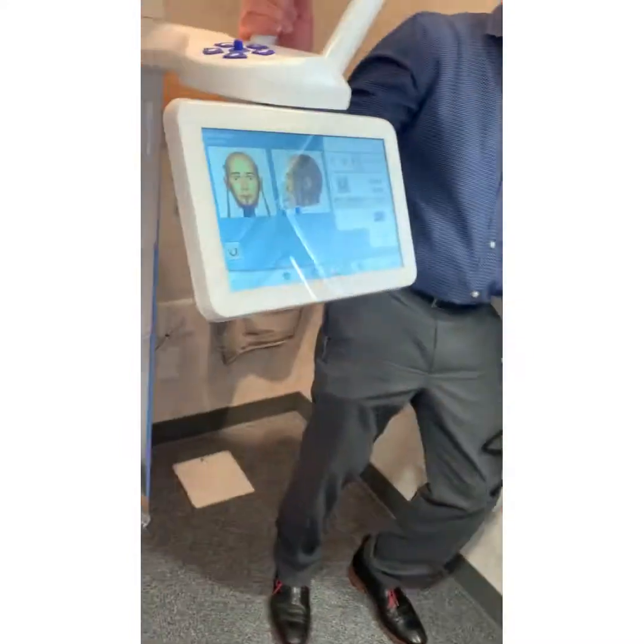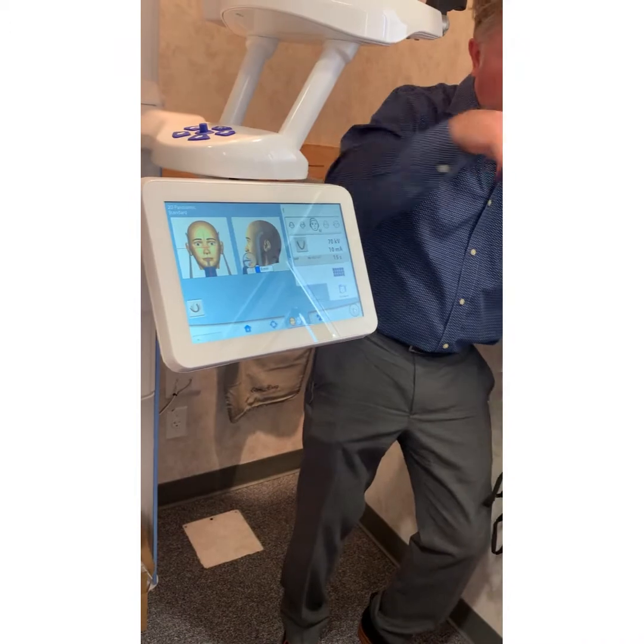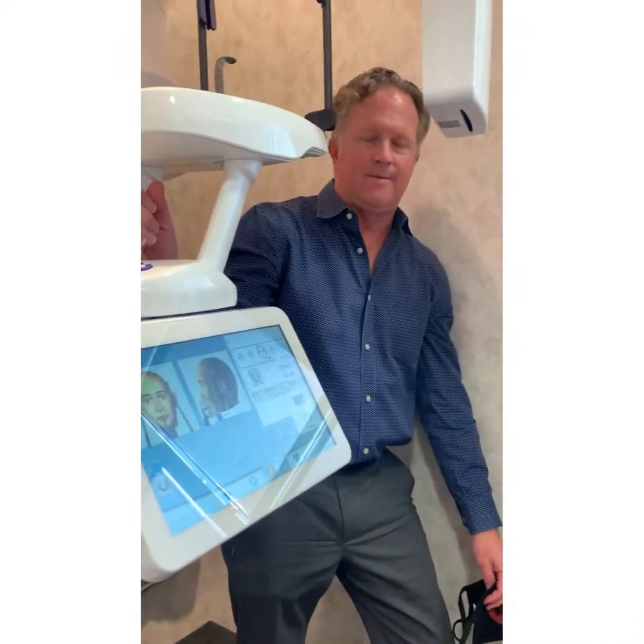I have a quick question about the apron. Let's say we get a big person and it's clipping on the apron as it's going around. You're saying technically you don't really need the apron? As we can all talk about, no. Okay. So in a pinch, you can just take it off. That's right. Got it.